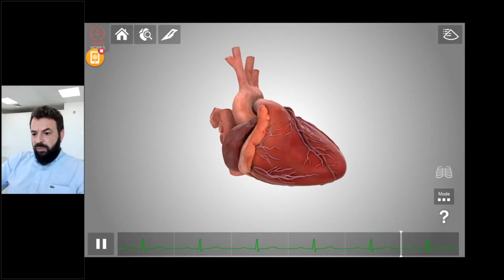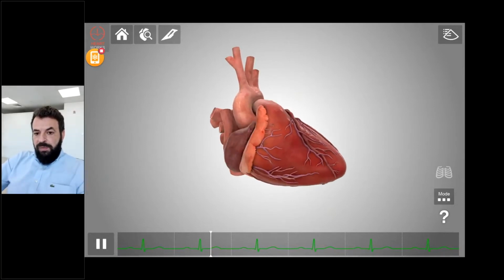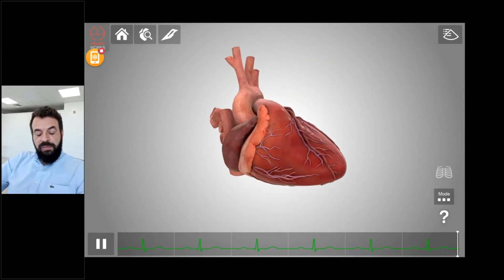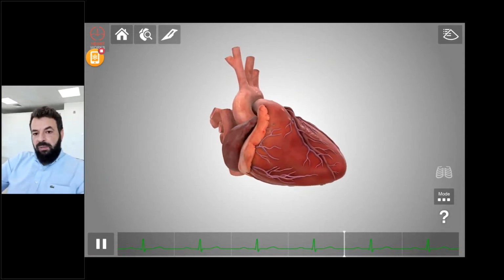As a brief introduction about the software, this is a software that is used for remote teaching and for students' self-improvement. The software incorporates cardiac anatomy. It also covers the sectional cardiac physiology, sorry, and the corresponding ultrasound findings.